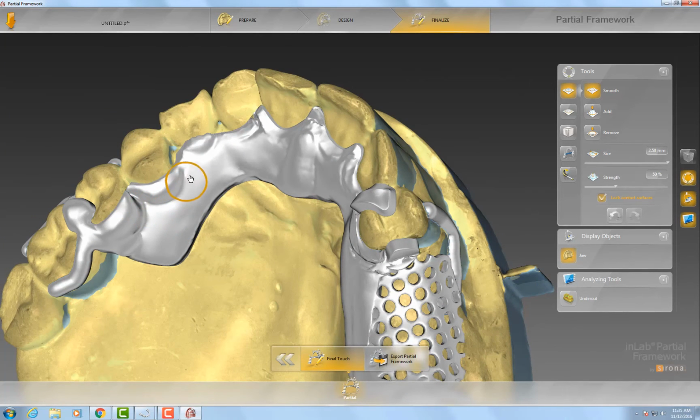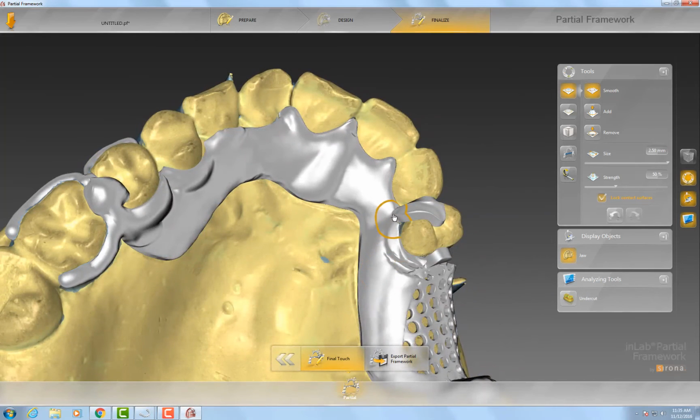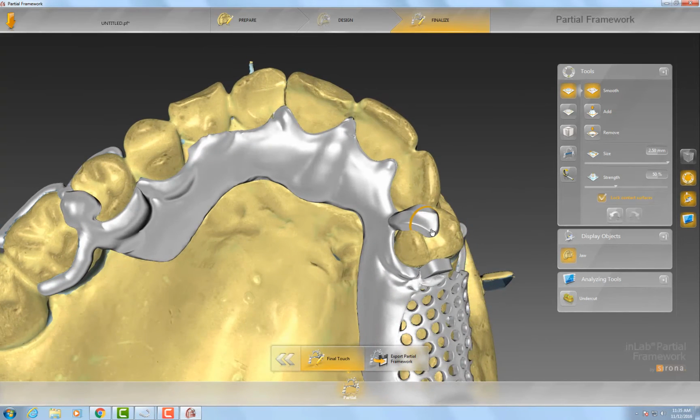Alright, so just kind of smooth that down. It does encroach on the thicknesses a little bit, so once it encroaches on the thicknesses, you're going to have to double check a lot of this stuff. And plus, since that's really thick right there, guarantee you your metal finisher does not want to finish that down all the way. It's kind of like the theories of some of the other advocates.